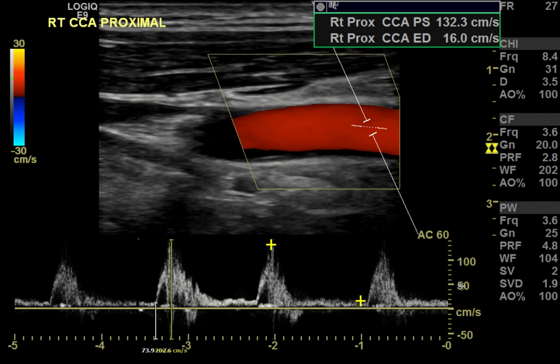The y-axis is going to be our velocity, but the time axis here we can see that each one of these numbers represent seconds. So each one of these hashtags within there are 10 of these, each equal 0.1 seconds. And so the amount of time that it takes to reach systolic peak within the common carotid artery looks to be about 2 of these, so this is 0.2 seconds.